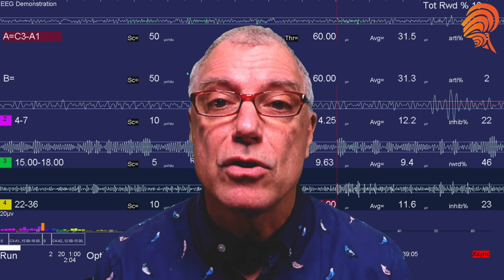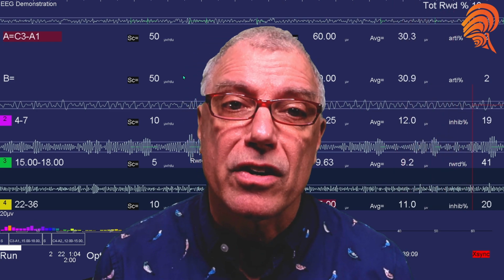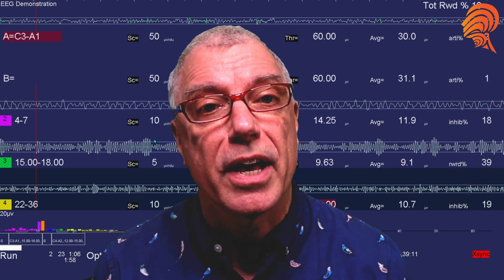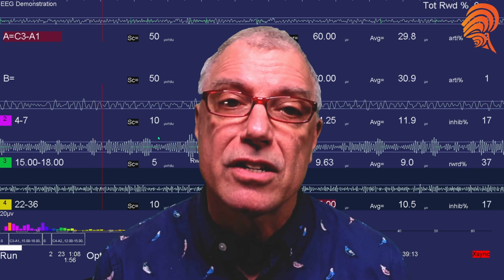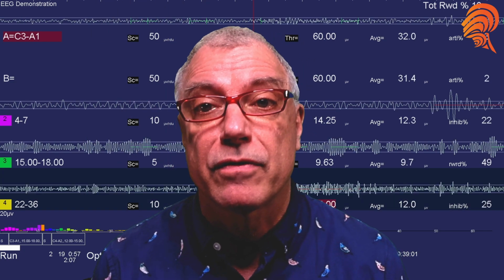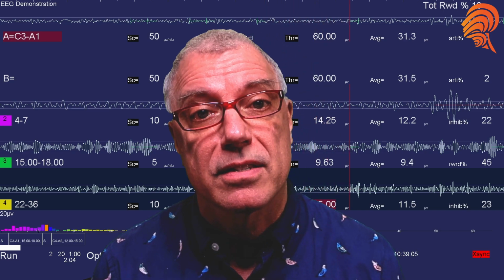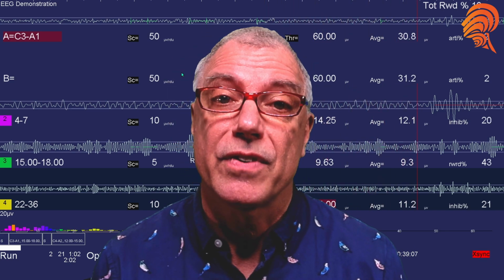And for beginning users, we draw attention to this feature because besides the artifact library, you can use replay to get better at making changes to a session on the fly without your client sitting right there in front of you. So it takes a little of the pressure off your learning process. So that's the EEGer replay session feature.